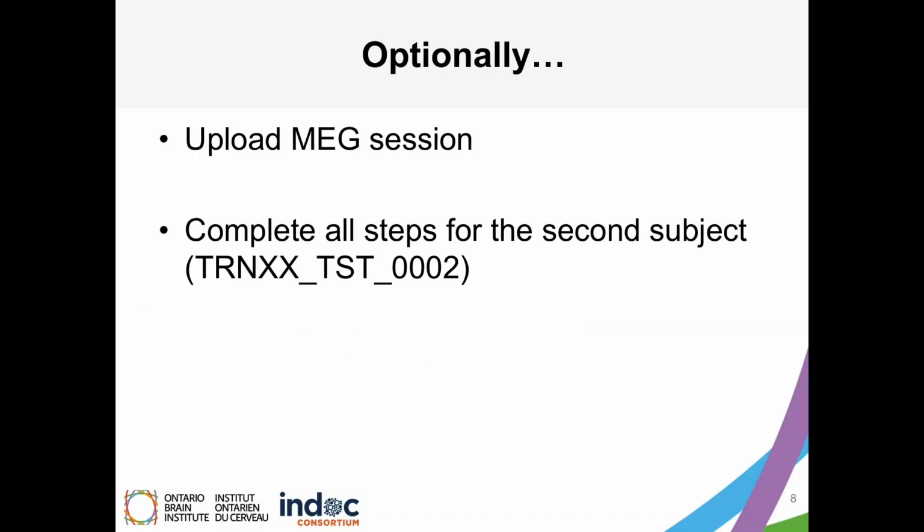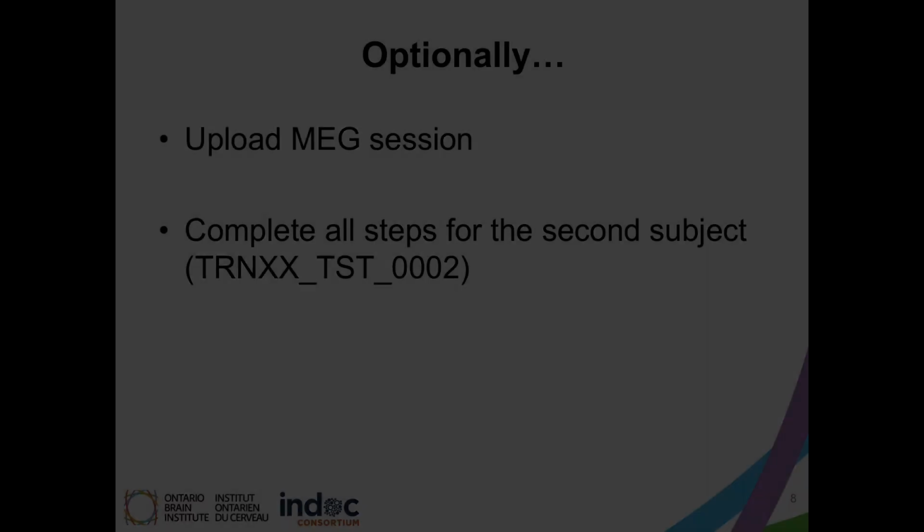Optionally, you may follow the instructions in the training manual provided within this module to upload the MEG session or redo all the above steps for the second subject. This is completely optional and is just for practice.